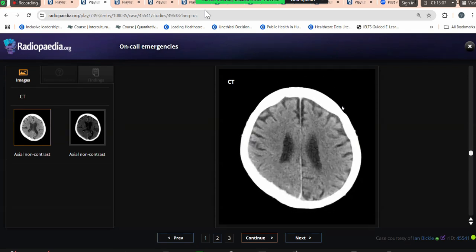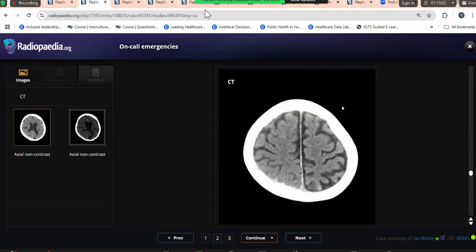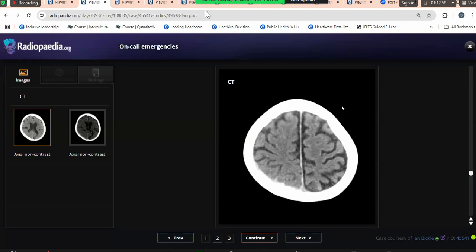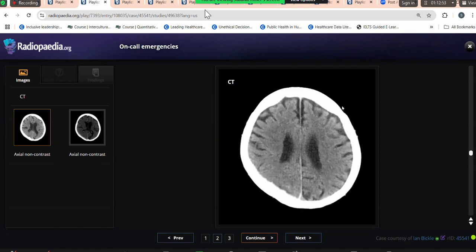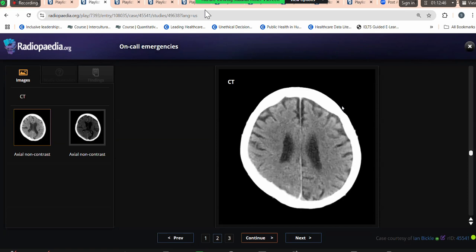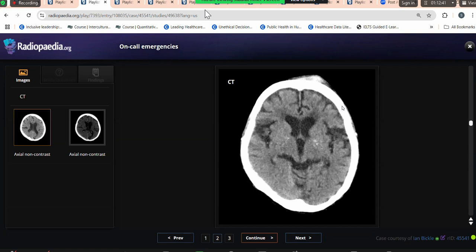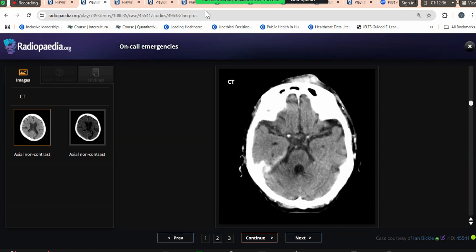So how would you like to conclude this case, candidate one? Ma'am, I'm not convinced about the neurological findings presented with the patient and the CT findings, so I just want to review the CT once again. There is an area of hyperdensity within the subarachnoid spaces in the right posterior parietal lobe. What do you do in your routine practice when you have suspicion? I change the windows. Can you take the next axial non-contrast and give me your comments, please?